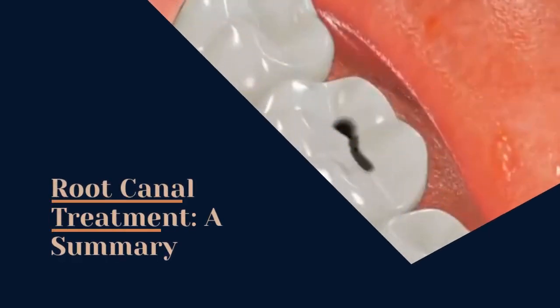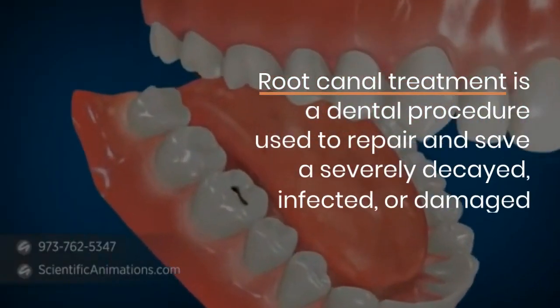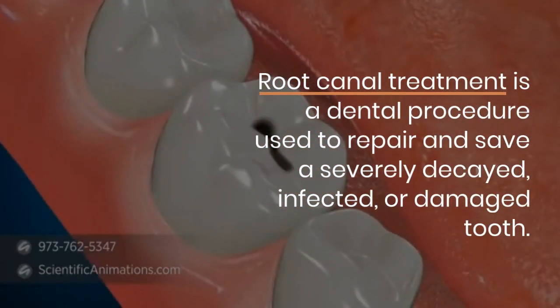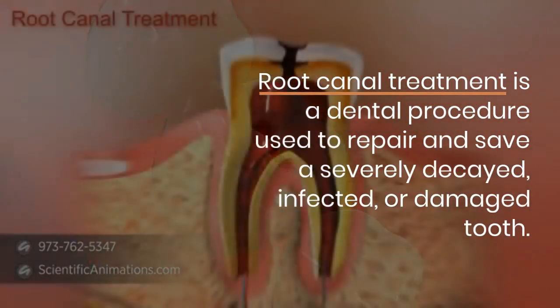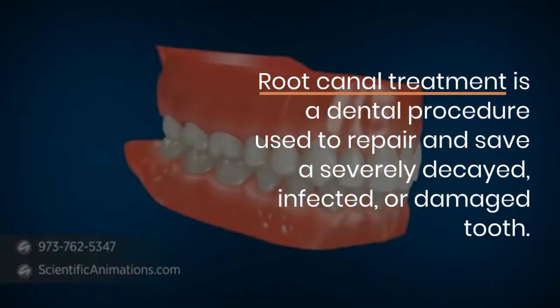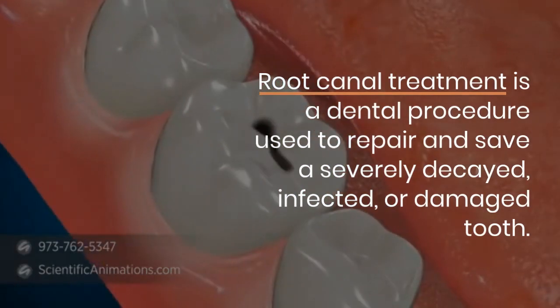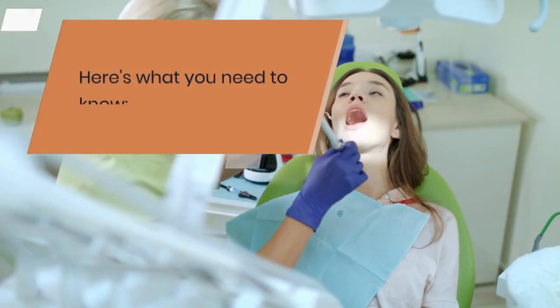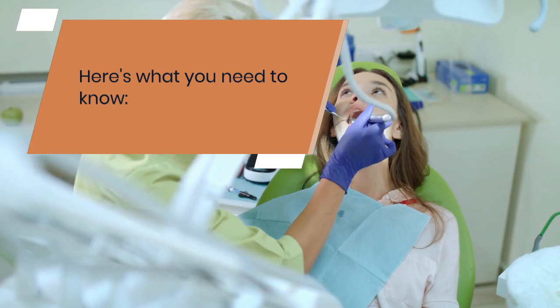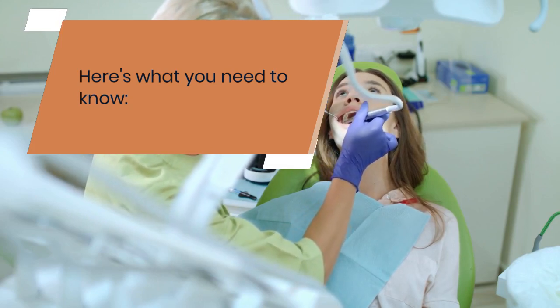Root canal treatment, also known as endodontic treatment, is a dental procedure used to repair and save a tooth that is severely decayed, infected, or damaged. It involves removing the infected or damaged pulp from the tooth's interior, cleaning and disinfecting the root canal system, and then filling and sealing it to prevent further infection. Here is an overview of the root canal treatment process.